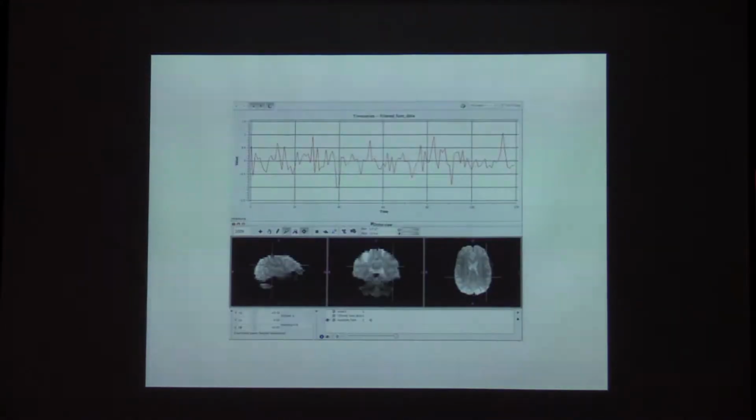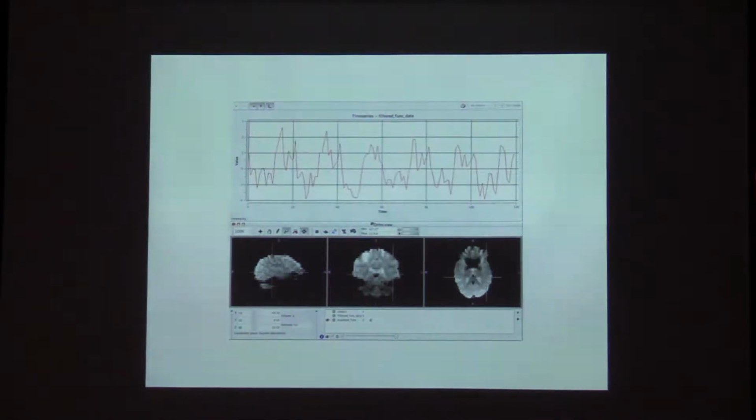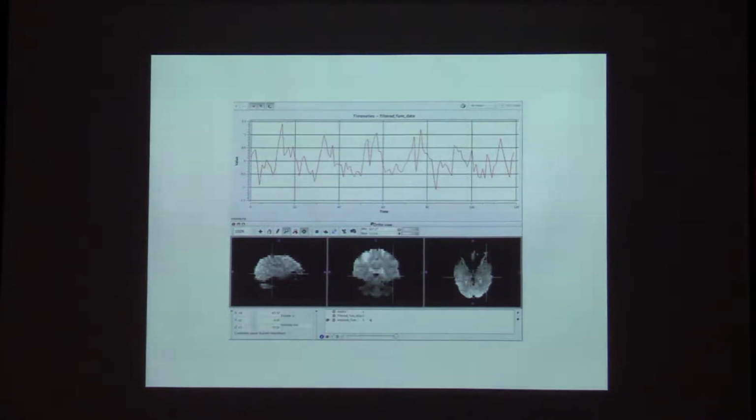So practically speaking, what happens is if you take a raw fMRI data set and you put a crosshair anywhere, then you have that waveform, which kind of looks random. It doesn't seem to make any organization, right? I go one voxel lower, it still looks kind of random. I go one voxel lower, still kind of looks random. More randomness, and then right next to it, suddenly you start seeing this. So now it's going up and down, conforming to that blue waveform that we saw, because we do on, off, on, off, on, off. We repeat this task multiple times. So this would be considered a voxel that is actually related to the task because it provided the blood flow that you expect. And then same thing here.